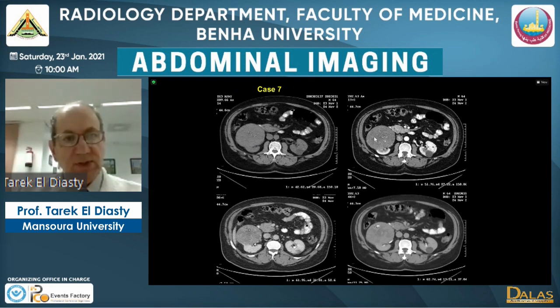It's a pre-contrast exophytic large lesion. In the corticomedullary and nephrographic phase it shows minimal enhancement, significantly less than the renal parenchyma, and no significant washout at the delayed excretory phase. So this mild enhancement with a prolonged or persistent pattern, with no washout, is characteristic of papillary cell renal cell carcinoma.